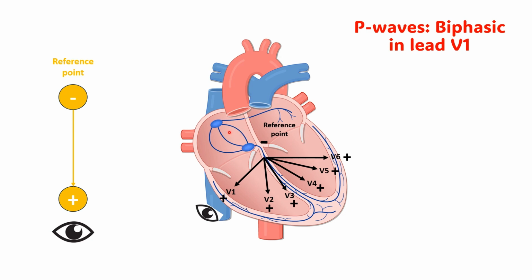The depolarization of the right atrium occurs in this direction, and it produces the positive deflection because we're going towards that positive electrode. But when the impulse travels via Bachmann's bundle, it's traveling away from this positive electrode, so it produces a negative deflection. That's why in V1 it looks like this, with an initial positive and then negative deflection. I hope that makes sense so far.